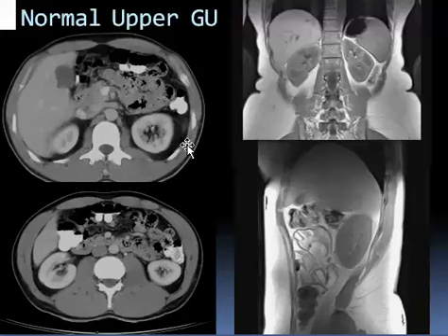Now, what is this? This is what we call Gerota fascia, and this Gerota fascia is closed along the lateral aspect, but downward it goes down blending with the iliopsoas fascia, and any collection outside the kidney within Gerota fascia will be enclosed in a closed bag laterally, but it can seep down and reach even into the inguinal canal along with the psoas fascia.